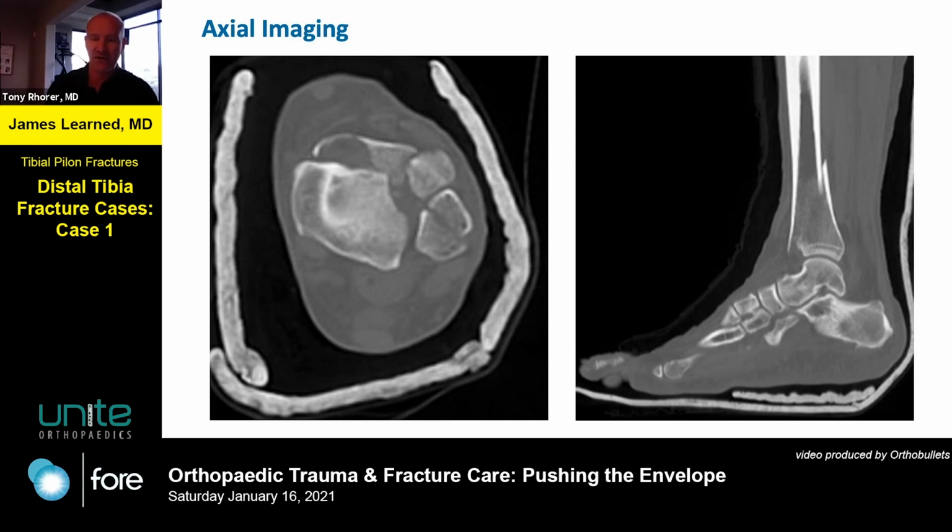But the shortening is what I struggle with, and the longer it sits like that, the worse it is. So my point is, when you X-fix these, you really got to hog on it and get that straightened out as much as possible. That's why I hate delta frames, because I don't believe you can control the distal end of the tibia through the calcaneus alone.